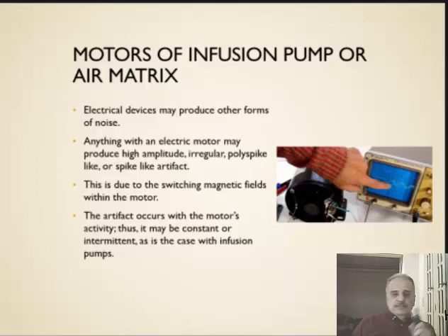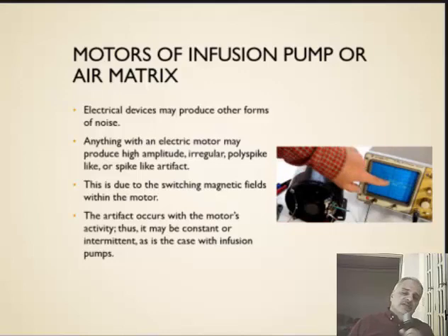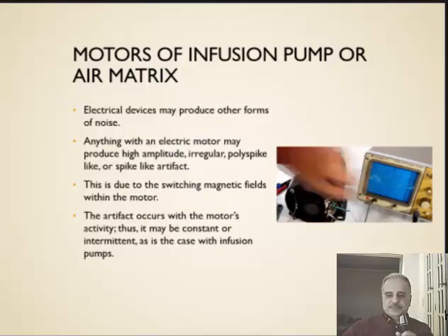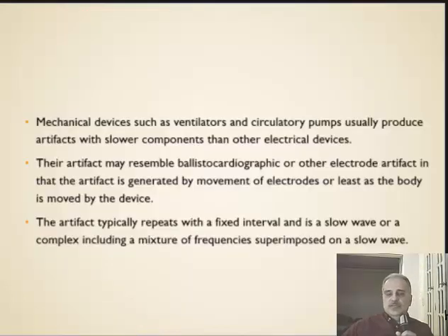Motor or infusion pump or air mattress: the switching magnetic field within the motor machine will produce this type of artifact. It disappears on switching off the machine. Look, each revolving machine gives this type of artifact. Alternating cycles of high frequency artifact is usually an electrical motor.